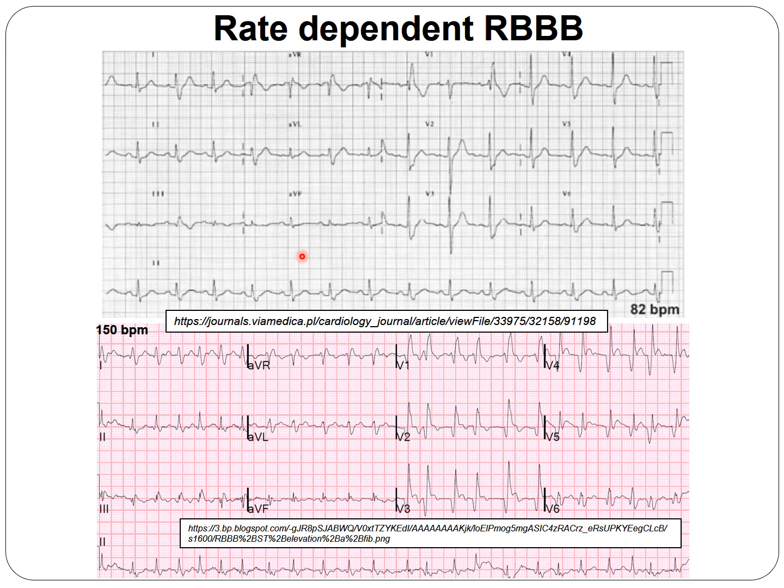As in other conduction disorders, these bundle branch blocks can have different severity. It can be second degree, can be third degree. When it's third degree, all the time we have the typical pattern of right bundle branch block or left bundle branch block. However, if it's only second degree, sometimes the right bundle or the left bundle conducts normally, but sometimes they do not. Usually this comes when the rate increases, and when the rate increases, the bundle doesn't have enough time to repolarize. This is why the typical right bundle branch block picture comes in every beat.